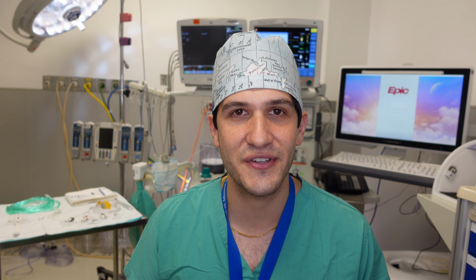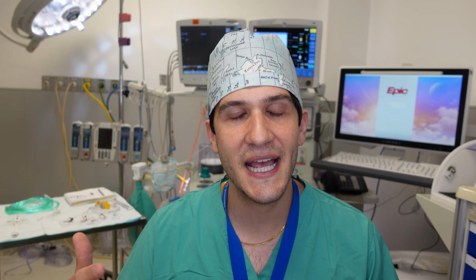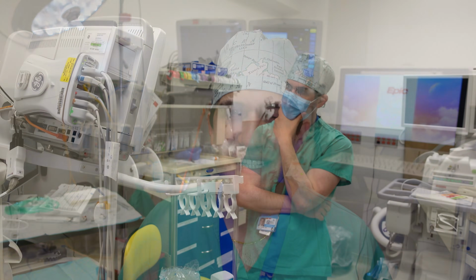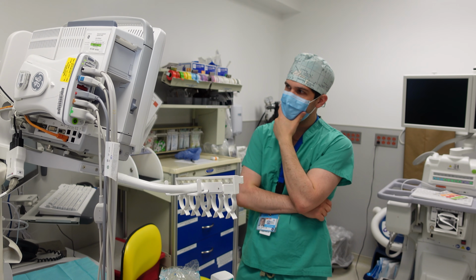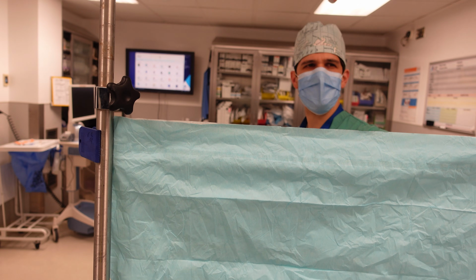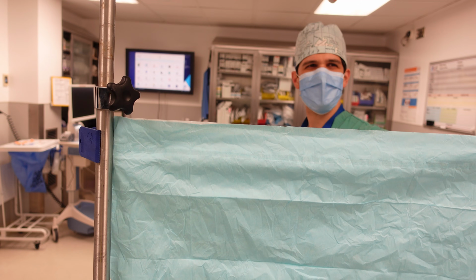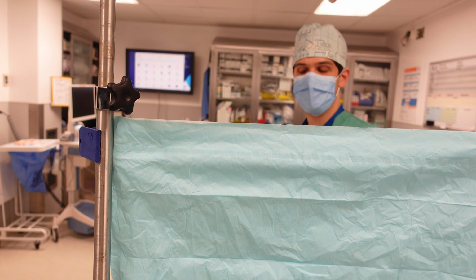And bear in mind that when a surgery is going on, the only person who is watching all of these vital signs at all times, you guessed it, anesthesia. One of the main reasons that I wanted to make this video is to give some insight into what's actually going through an anesthesiologist's mind during surgery. And from the surgeon's perspective, it can often seem like maybe the anesthesiologist is just over there staring blankly at the computer screen. They might be planning their next exotic vacation to some foreign, strange place like Florida or something.